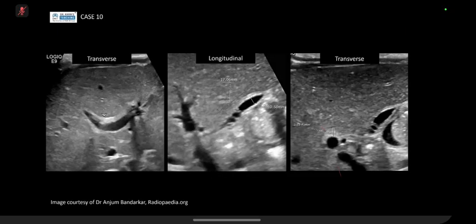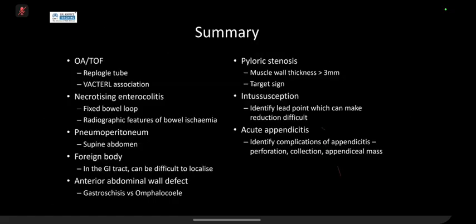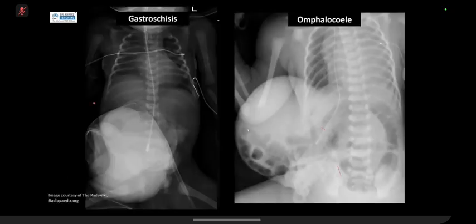So in gastroschisis, because it's just bowel, often they also put what we call a silo. It's just a plastic covering over it, which can make it hard to differentiate from omphalocele. Of course, you can also look for what's herniated within. If you've got more gas-filled bowel loops, it's bowel in gastroschisis, and in omphalocele, there's bowel and liver. So it can be easily said, there might be something else rather than bowel. The other thing that they might want you to do is an ultrasound to see exactly what's herniated, and you can help to characterize it further.